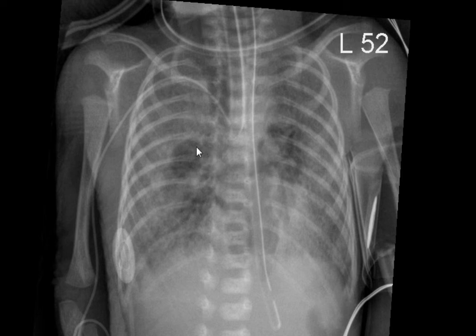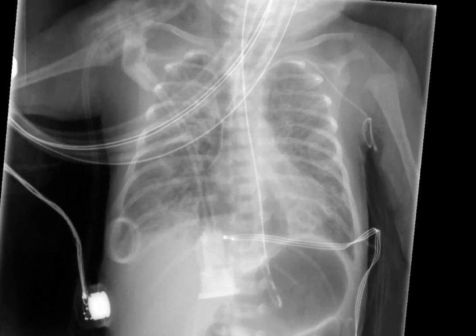A posterior pneumomediastinum will also dissect in the soft tissue of the neck, as you see here, and this patient also happens to have both focal, large rounded areas of interstitial air as well as linear interstitial air. There's also focal interstitial emphysema in the left hilar region as well. There's another patient with what looks like a posterior pneumomediastinum surrounding the nasogastric tube. In this case, also has focal interstitial emphysema in the medial aspect of the right lung, and you can see air dissecting into the soft tissues of the neck.